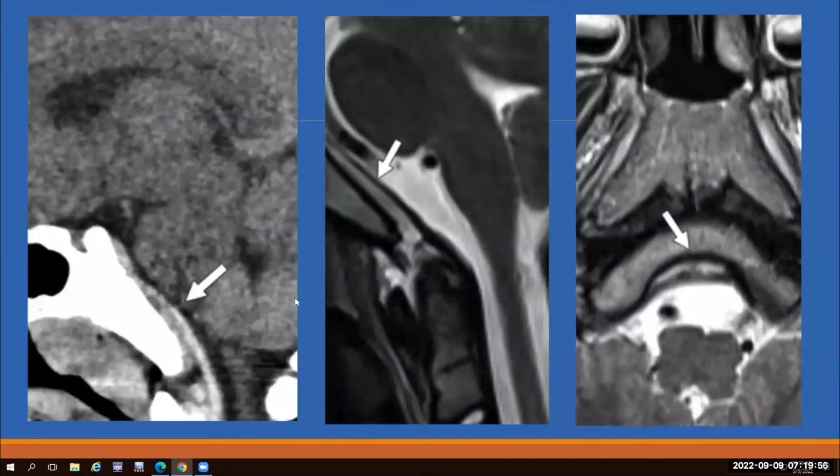The reason is that in kids the ligaments are more lax. Histologically, the ligament consists of a different degree of flexibility. So instead of rupturing the ligament, it tends to peel off the retroclival dura. The CT appearance here is a retroclival epidural space hematoma.